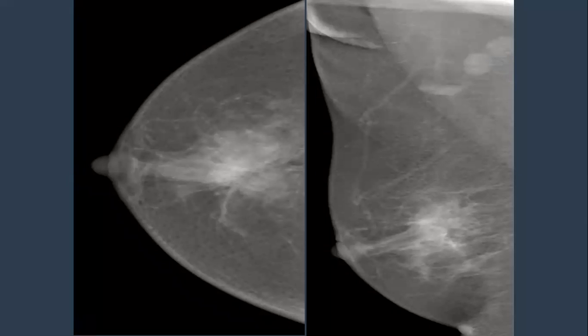This is a limited evaluation. It needs to be visualized by ultrasound to confirm more suspicious features. But here, at least, it is globular rather than oval, and there is a subtle area of perinodal edema, raising suspicion for a metastatic node, to be clarified and characterized further by ultrasound.